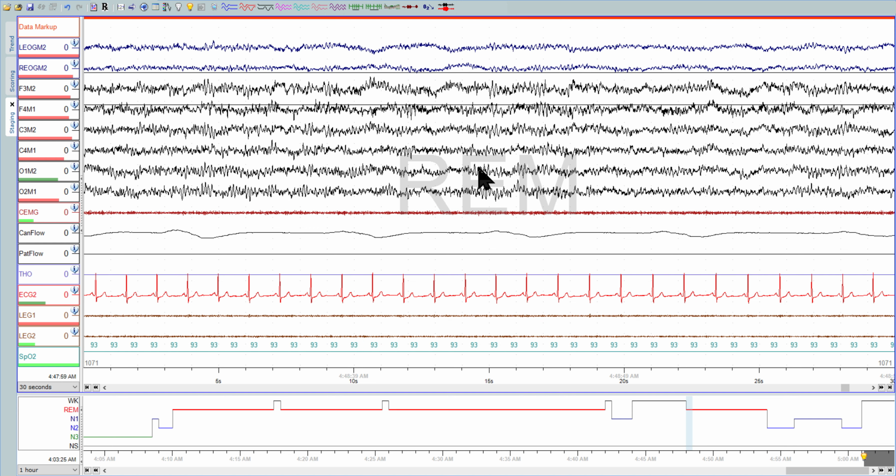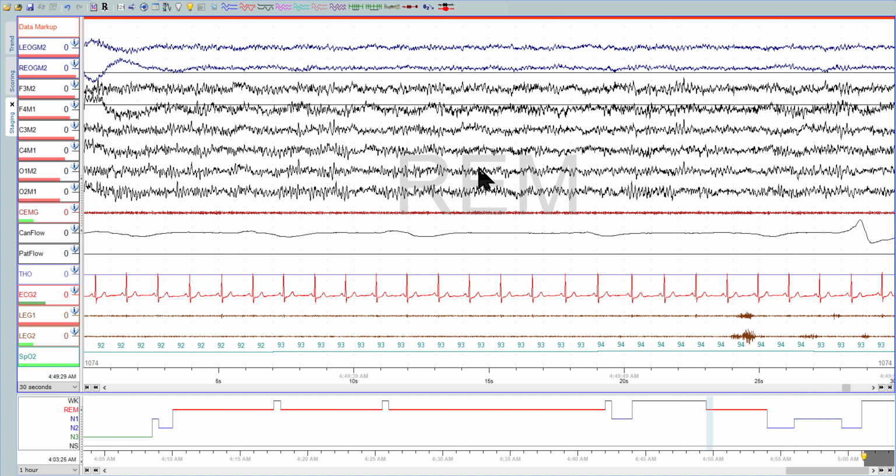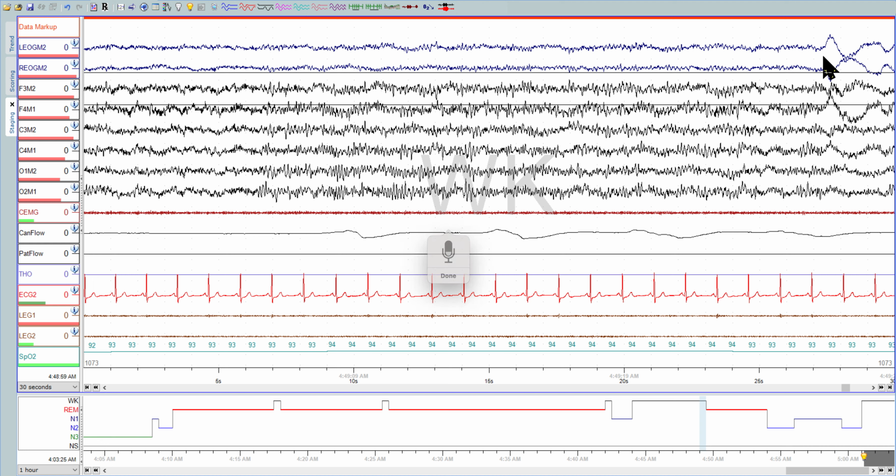And then all of this is just wake. There's no sleep brainwaves in here. And these aren't rapid, these aren't really rapid enough. You kind of want to have a pointy edge to it. And rapid eye movements, well, I guess it could be a rapid eye movement, are 0.5 seconds usually.